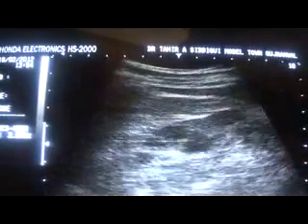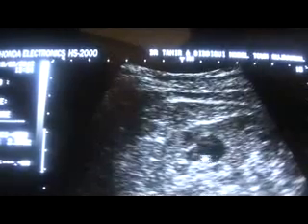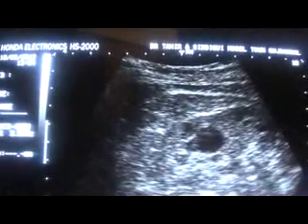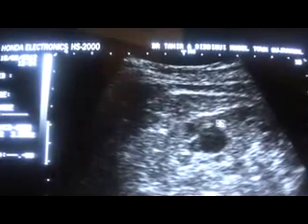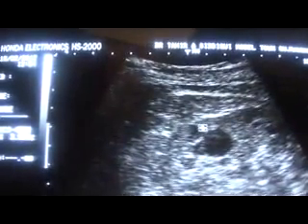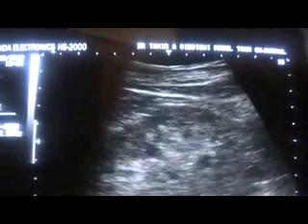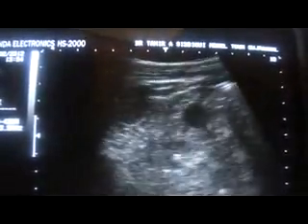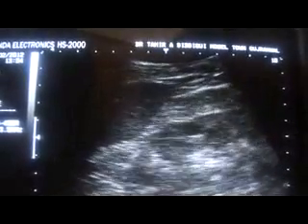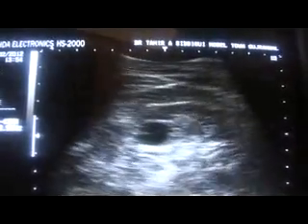So the size of the cyst is important. It does not range above 15 centimeter, and secondly, its outer surface is smooth. Thirdly, they are present in the parenchymal region, and number 4, the capsule of the kidney is not disturbed. You see, the capsule is intact. These are the differentiating points, and their size varies. They do not communicate with each other.